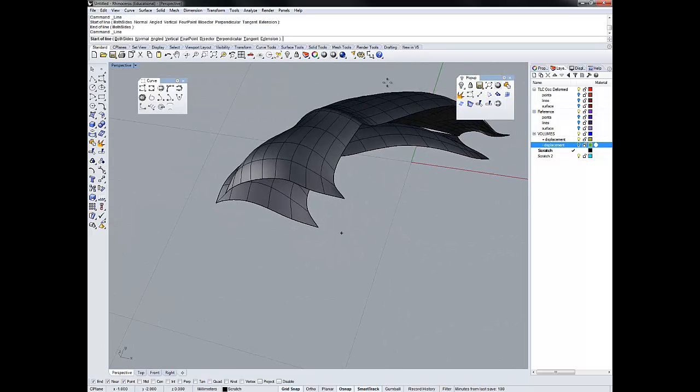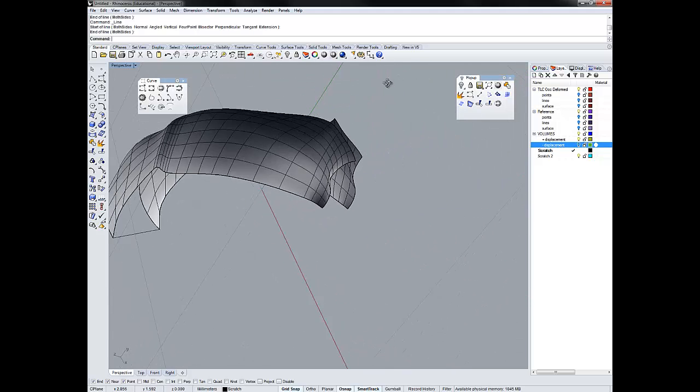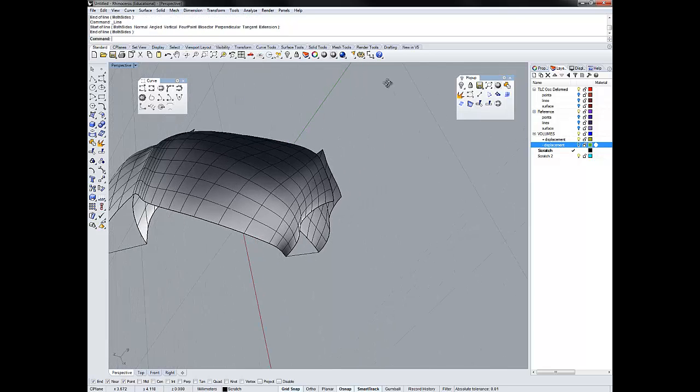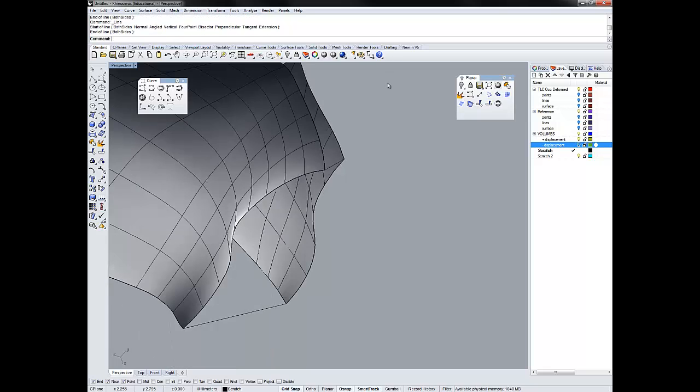So I can right-click to redo last action. I can hover over this end, go to this end. I'm going to do the same at this tip here. Right-click, left-click the end, left-click the end, and I can also do the same thing here and here. So zoom in, right-click, left-click, left-click, done.